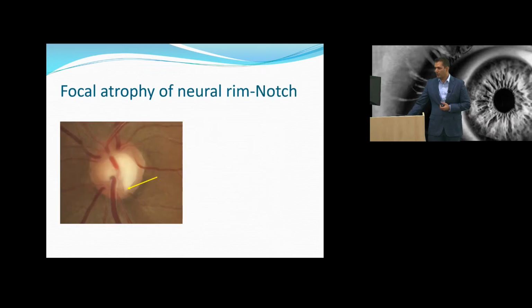I want to show you another picture. Look right here. First, let's start with the boundary of the optic nerve head. Okay, so that's the boundary. The rim tissue is much more obvious in this case. So you can see all this is rim tissue, rim tissue, rim tissue. That's cupping right there.